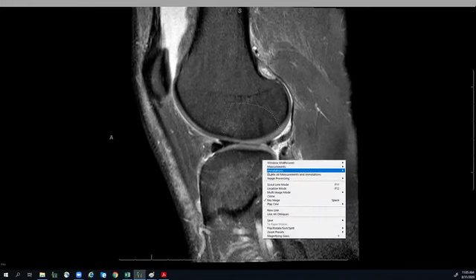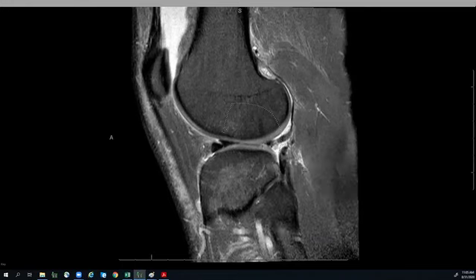It used to look like a triangle in this direction, and then it's completely inverted itself when it's displaced into this location. That's why we refer to it as flipped.